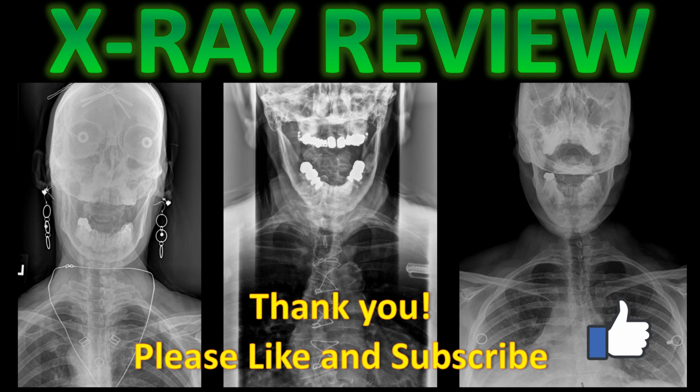So thanks for listening, and hopefully you enjoyed learning about the modified frontal APOM cervicothoracic view and why not to take it. And remember, if you want to image the cervical spine or thoracic spine, take dedicated images of those regions.